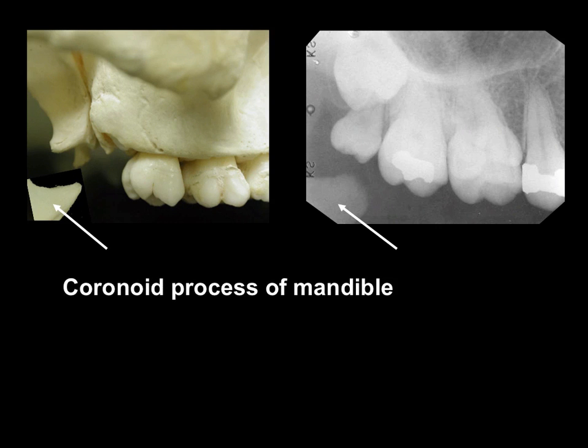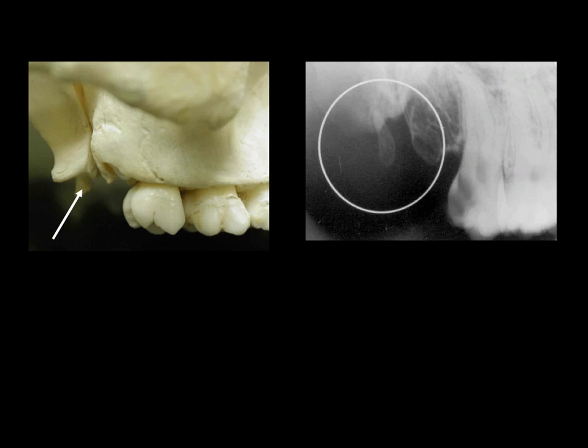Here we see a radiograph of a patient who's been very tolerant and the radiograph has gone a long way back into the mouth. Beyond the tuberosity, we can see a little finger of bone. Now, what is this? Well, it's the pterygoid hamulus.